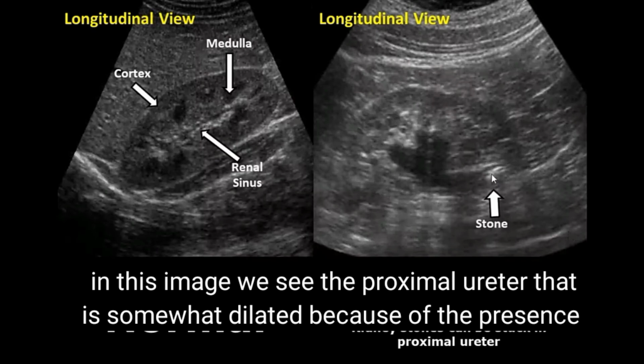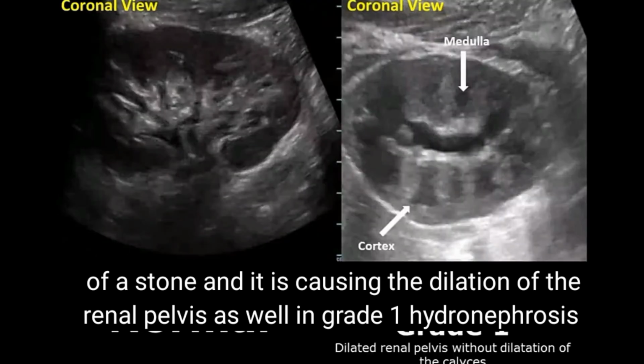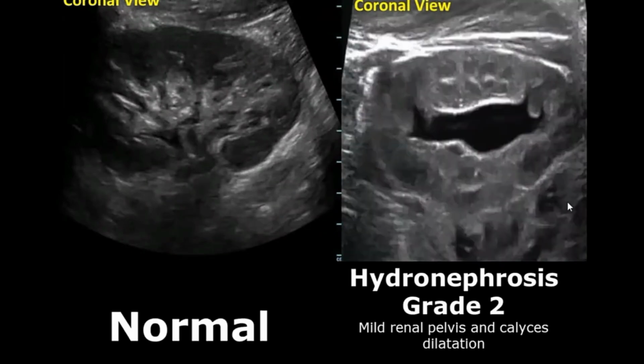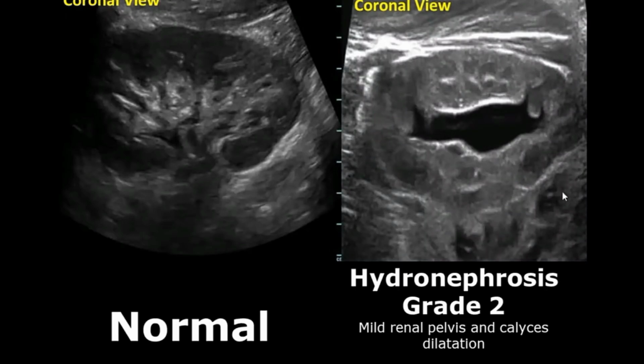In this image, we see the proximal ureter that is somewhat dilated because of the presence of a stone, and it is causing the dilation of the renal pelvis as well, in grade 1 hydronephrosis. The renal pelvis is dilated but the renal calyces are not dilated. In grade 2 hydronephrosis, both the renal pelvis and the renal calyces are dilated.